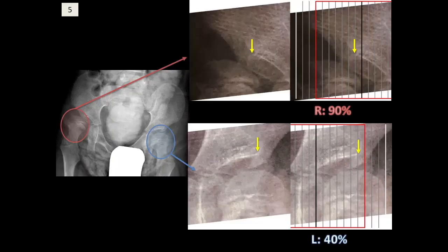We'll do the same on the patient's left hip. White lateral, black medial, and then assess which line touches the lateral aspect of the acetabulum. And we can do a little bit of toggling to make sure we like our landmarks.